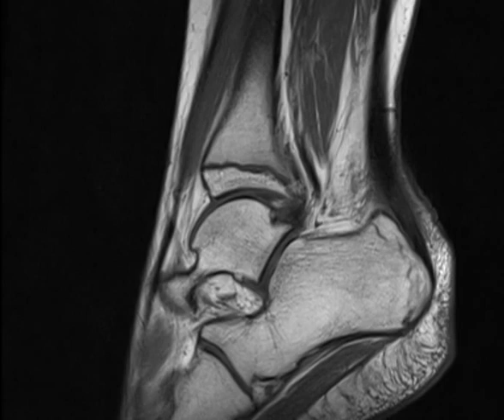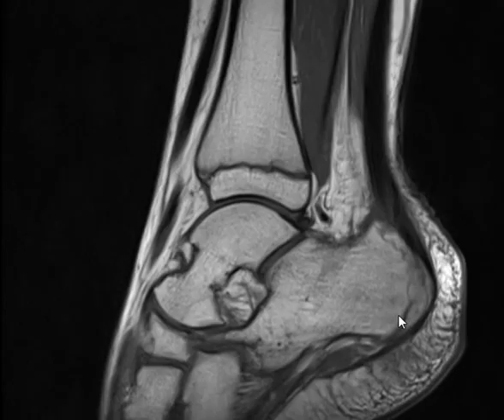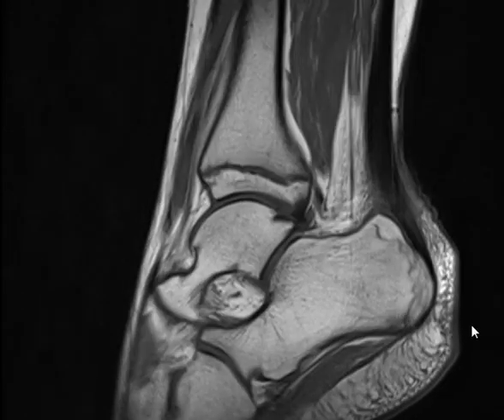So what's our diagnosis, differential, impression, whatever. How do we write it to the orthopedic surgeon? Bone marrow edema, calcaneal apophysitis, infection first. Repeated trauma, at age of 12 years, doing sport, jumping. So repeated trauma means what? Stress fracture, for example. Stress fracture, calcaneal apophysitis second.